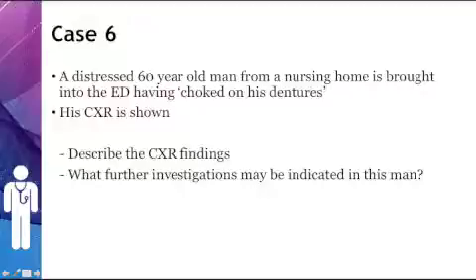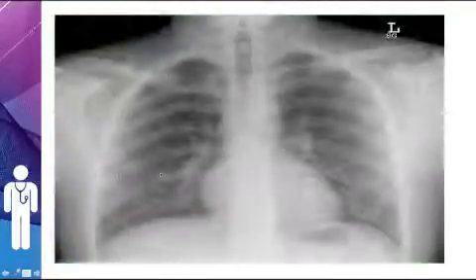So this is a 60-year-old man from a nursing home who's choked on his dentures. Describe the X-ray and what you may do after you've done the X-ray.